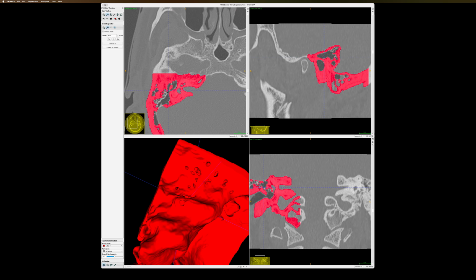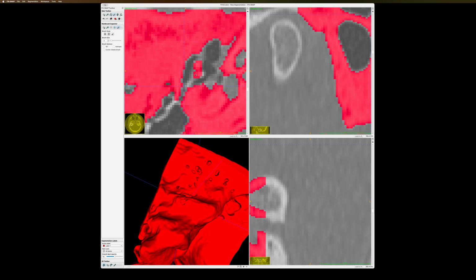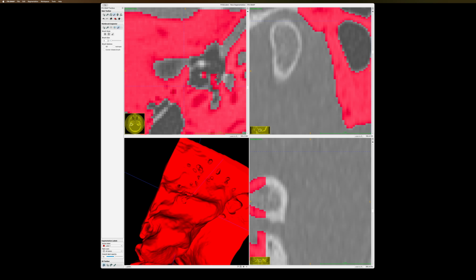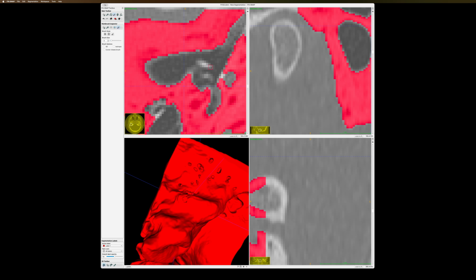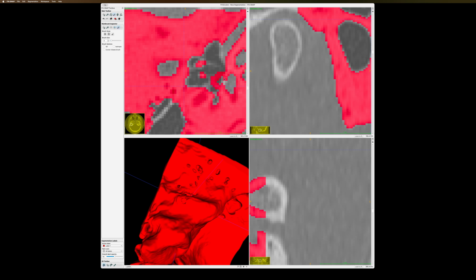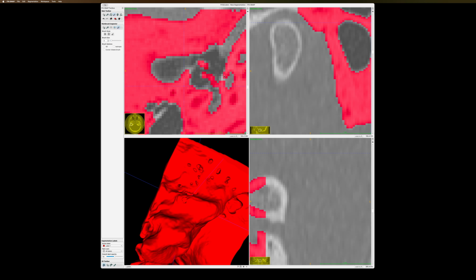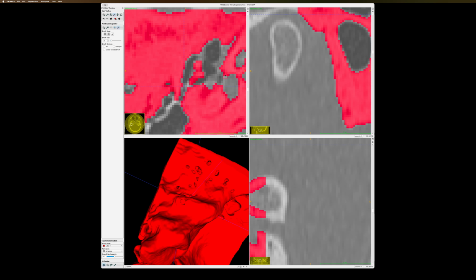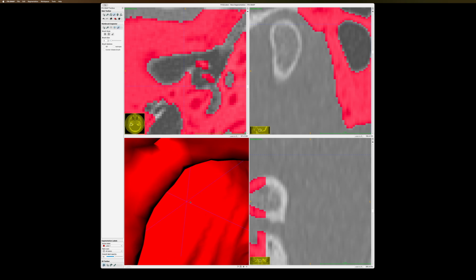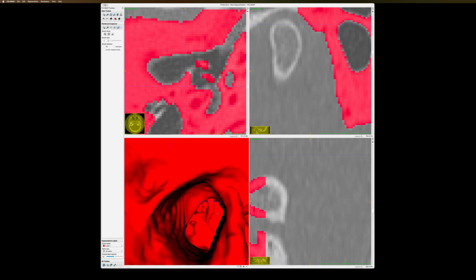There are multiple ways of doing this. Now I'm going to focus on the ossicles, for example, just finish them and be sure I captured all of it into my model. It is obviously very important that you know your anatomy very well, not just filling in blindly. The nice thing about this particular CT scan is it is a dedicated CT of the mastoid, so it is high resolution. And the fact that I know how the stapes should look and which position allows me to do this.